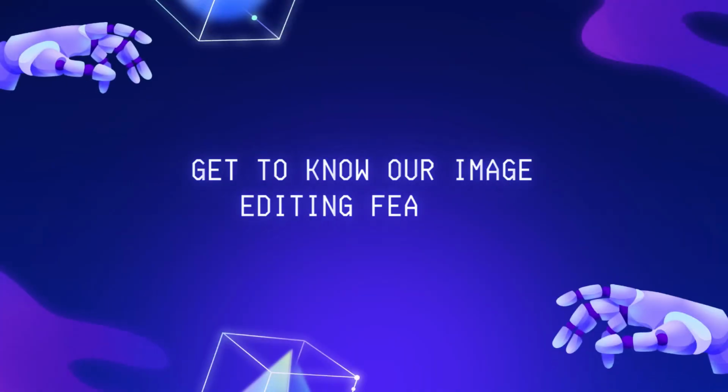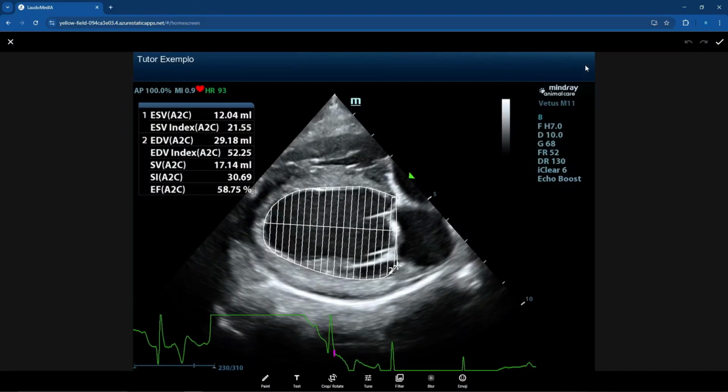Get to know our image editing feature. When you enter the image editor, you'll find several tools in the bottom menu. Let's start with the painting tool, which allows you to draw freely on the image. We can also add shapes, such as arrows, which can be colored to identify different types of lesions. Lines, rectangles, circles, and dotted lines. If needed, you can erase any created shapes.